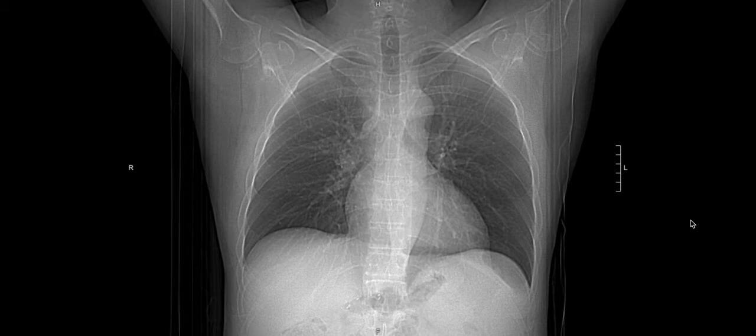One of the first things that we look at as part of our search pattern for CT scans is the scout imaging. Oftentimes, people can blow past the scout imaging because they think, we have all of the cross sectional imaging. What utility does an image like this have? What's important to realize is that the scout image provides a little bit of different information.